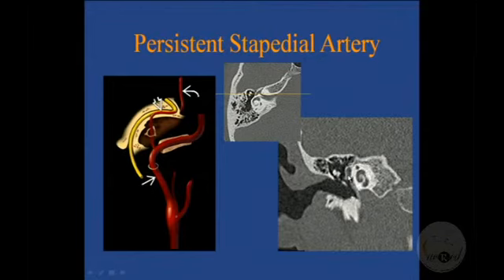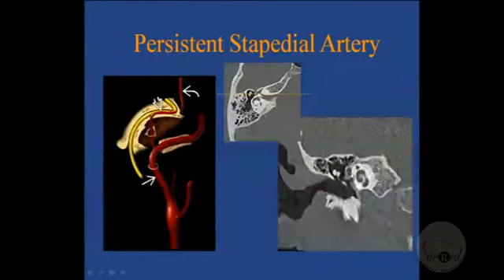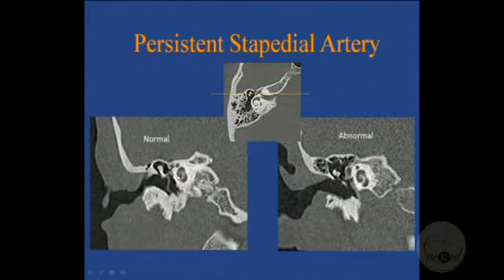That's only the nerve. To give you a sense, that's the normal side. So these two segments should be symmetric or similar in size, because only the facial nerve runs through that. If it is disproportionate, that's a labyrinthine segment which is smaller, only the nerve, and this is nerve and vessel, that's abnormal. Then if I see this, I go back to the bottom cut on the axial image here and then look for the stapedial artery.